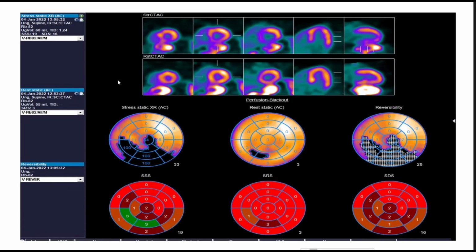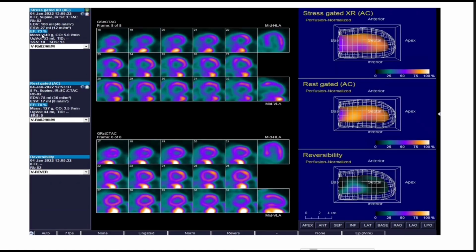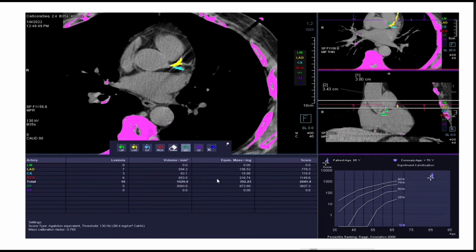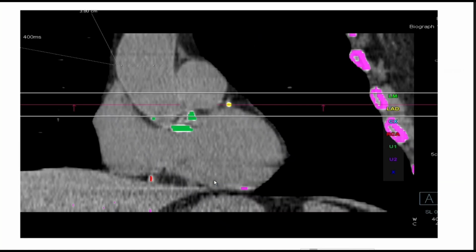Now, we just did a vasodilator on somebody who has significant aortic stenosis, and we see the same phenomenon occurring. We see TID, which is something we see with global ischemia and significant ischemia. We see the EF dropped when we did the stress on this individual. So we're seeing the same effects that you would see. However, it's a little more controlled and it's not as severe with the vasodilator as it is with physical exercise, because we're not trying to drive their blood pressure up as well.